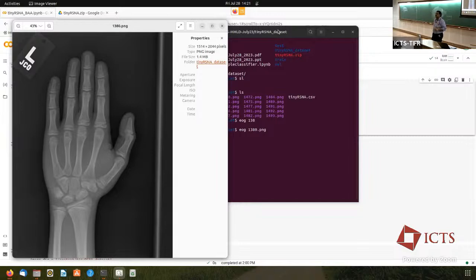Is this clear? If not, you can discuss with me later. Basically, our goal is not to get into those details. Our goal is to decide, is training error coming down? What is our acceptable validation loss? So that we can check whether our predictions are close enough to the ground truth. That's what our goal is going to be. Okay, so your loss landscape will be constructed from this loss, and your weights will be changed.